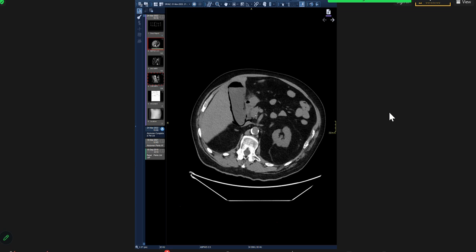It is like mesenteric ischemia, but it is gallbladder ischemia. And then it developed like when you have pneumatosis, here in the gallbladder wall, and then it perforated finally. When it couldn't take it anymore, then it perforated.